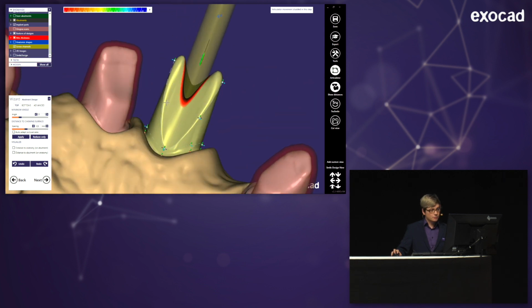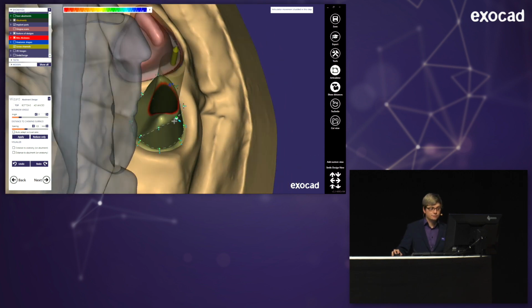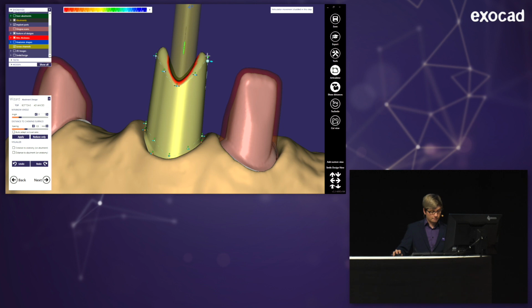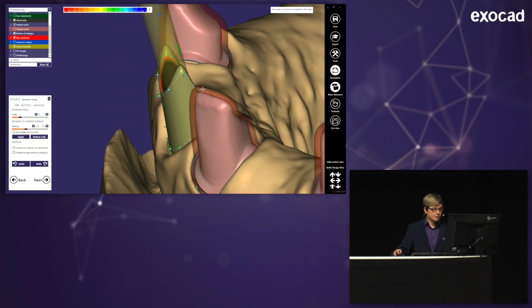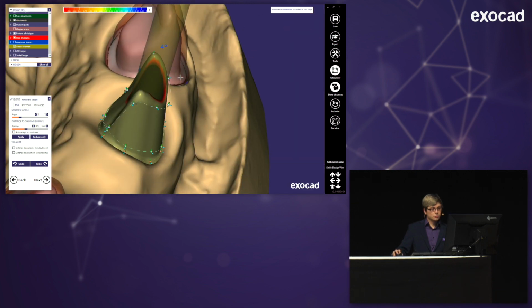And here on the back side as well. So now I can actually design a bit of an edge here. I can take my antagonist into consideration and see if there's enough space for it, and it is, even more than here. But I'm pulling down those control points here, so I have nearly the same length as the other dies. And now the points in the front, I try to push a bit inwards, but they're already at the limit. But this looks OK.